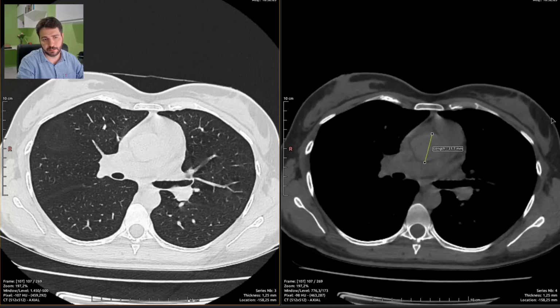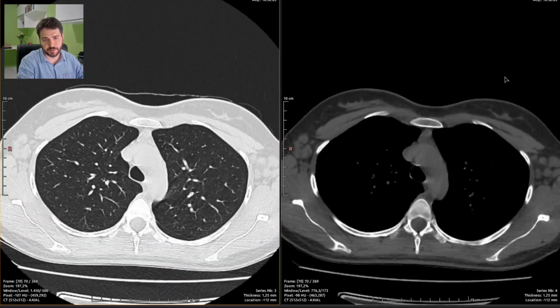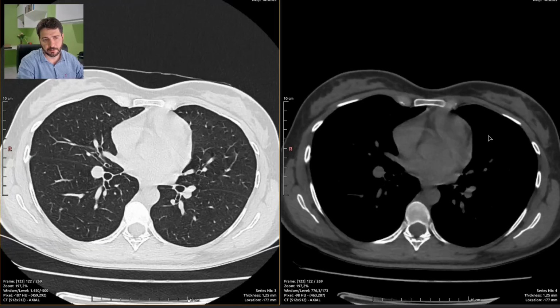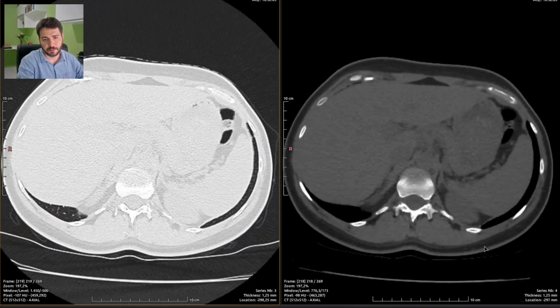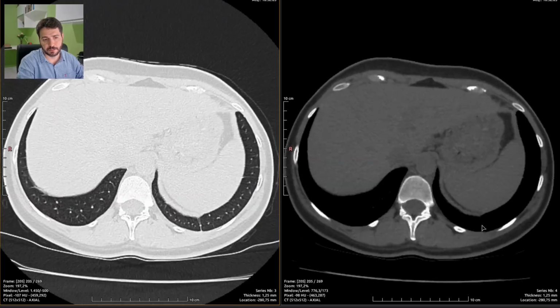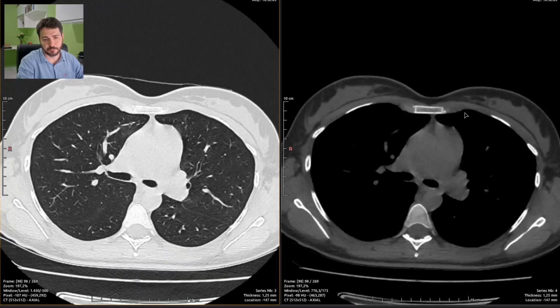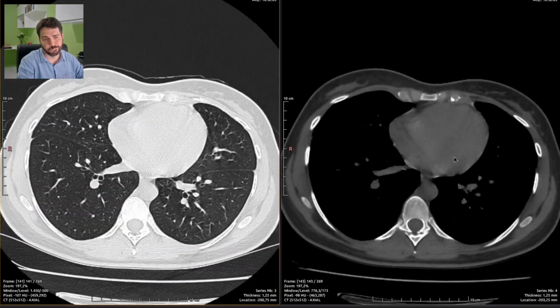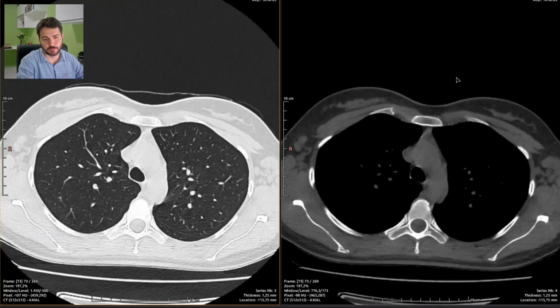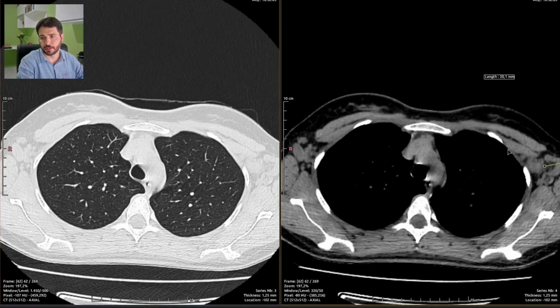And lastly, let's see the lungs. Slowly but surely. Is there anything wrong with the lungs? No, can't really tell. I guess it's okay. No disease. So just the enlarged lymph nodes.